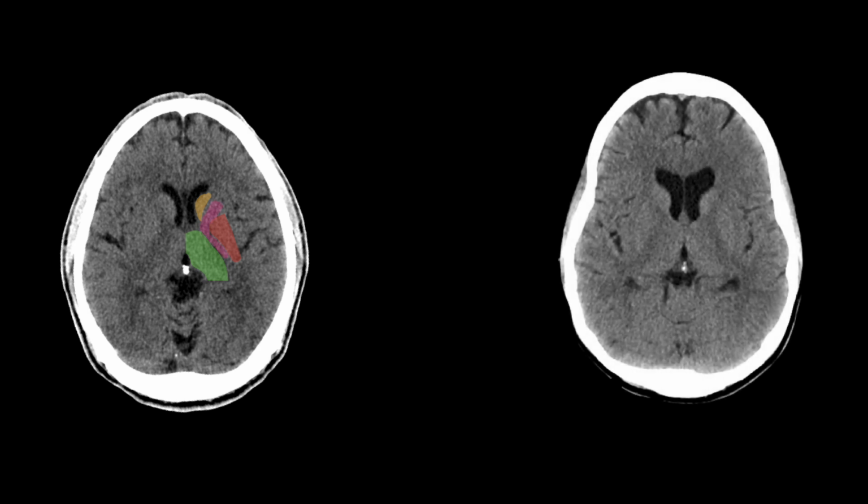This is very important when you're looking at a patient with strokes, because strokes can happen in multiple locations, but they happen a lot in the internal capsule. The internal capsule is a very tight spot where even a very minor bleed can compress and cause a mass effect on a lot of motor and sensory nerves.